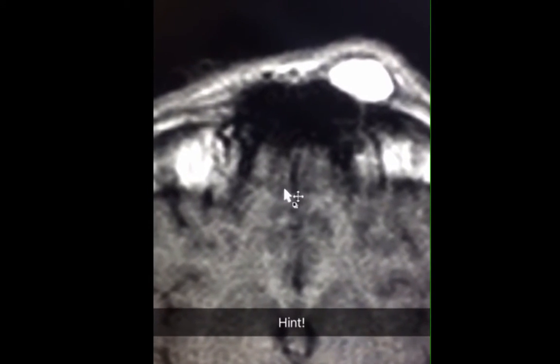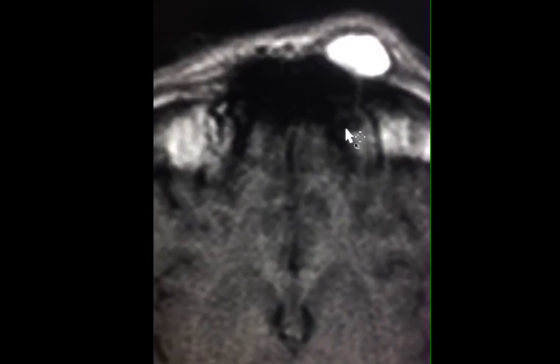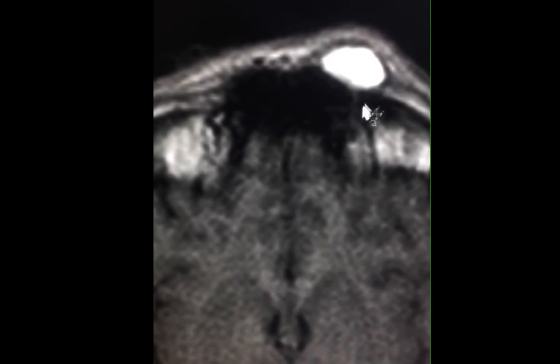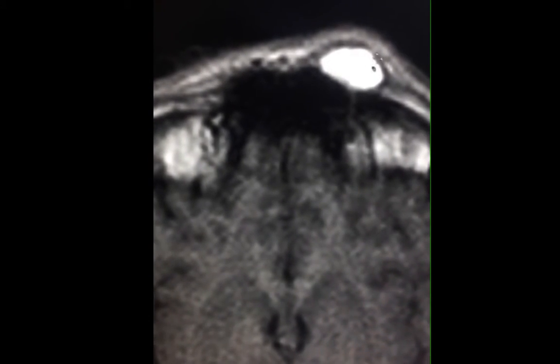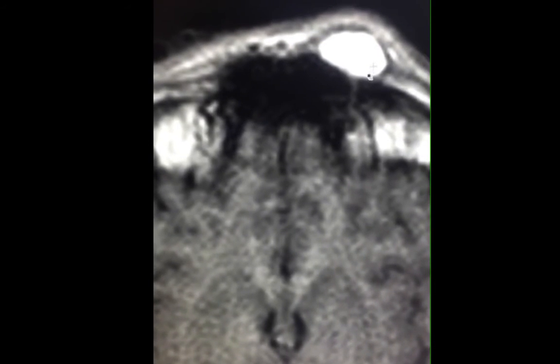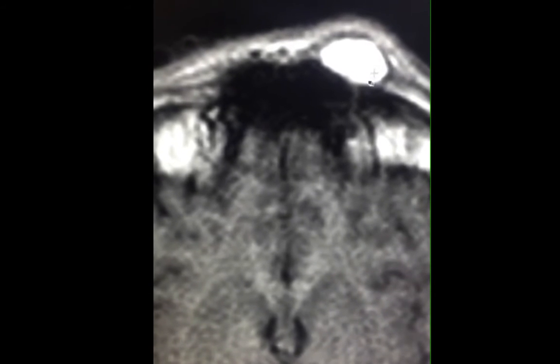In general, the lesion does not show any aggressive features. However, the hint to this lesion is seen on the acquisition that you see in front of you. You have noticed that the abnormality is bright on the T2 weighted sequence. However, it's also very bright on the T1 acquisition. Since most lesions are hypo-intense on T1, hyperintensity on T1 is a very important hint.